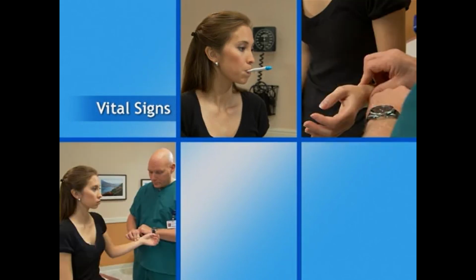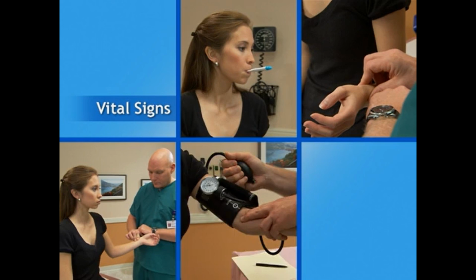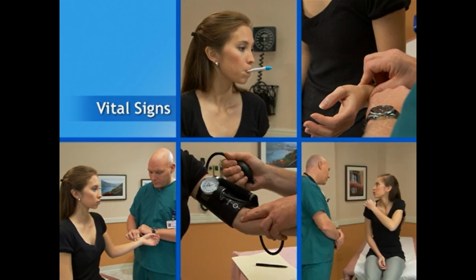The 5 vital signs are extremely important indicators of a client's health status, and abnormal findings indicate a problem in one or more body systems. Become familiar with the methods and equipment for measuring vital signs. Thermometers, peripheral pulse palpation, counting respirations, using the stethoscope and sphygmomanometer to measure blood pressure, and pain assessment, in which you gather subjective data using therapeutic communication methods.